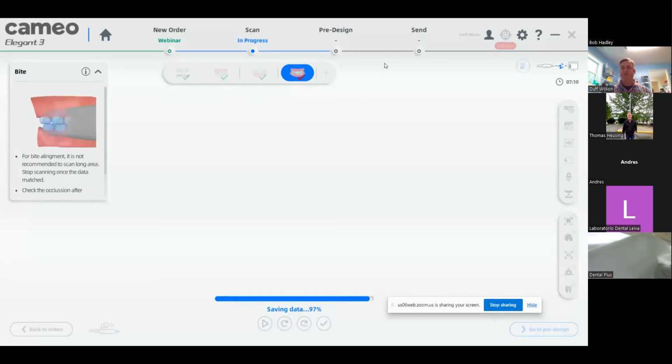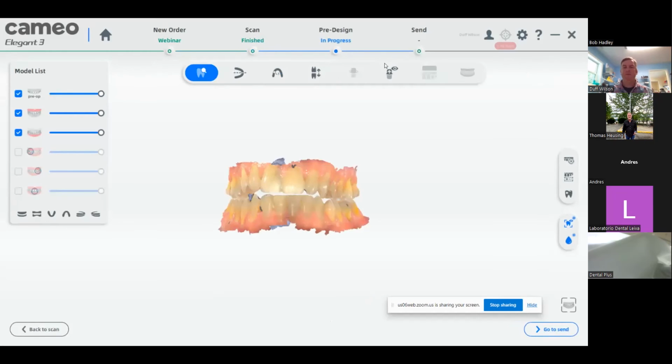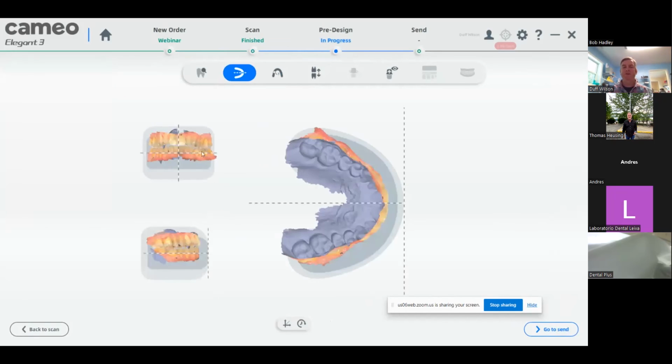All right, so we're almost done calculating. All right, so here's our features here. And so you can just check it all out. And then you can go to your coordinate adjustment. So you can see it's too high.